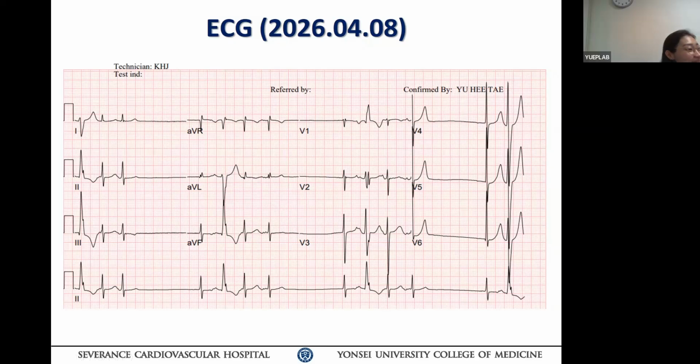After major surgery, the surgeon cuts down the atrial tissue, so the P wave is very, very tiny voltage. Sometimes we cannot notice it. The only way to determine whether it is a P wave or junctional rhythm is to hook up the atrial epicardial pacing lead to the ECG machine. Then you can determine whether it is a real sinus P wave or a junctional rhythm.